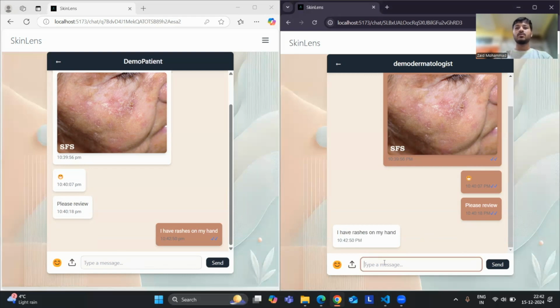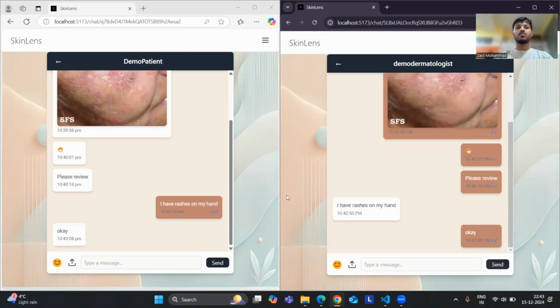Let's similarly send a message from the patient dashboard. Yep, in real time it's updated.